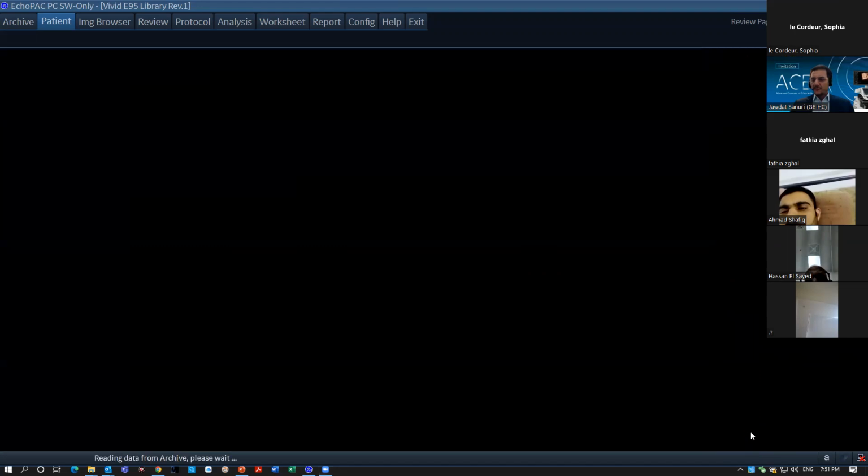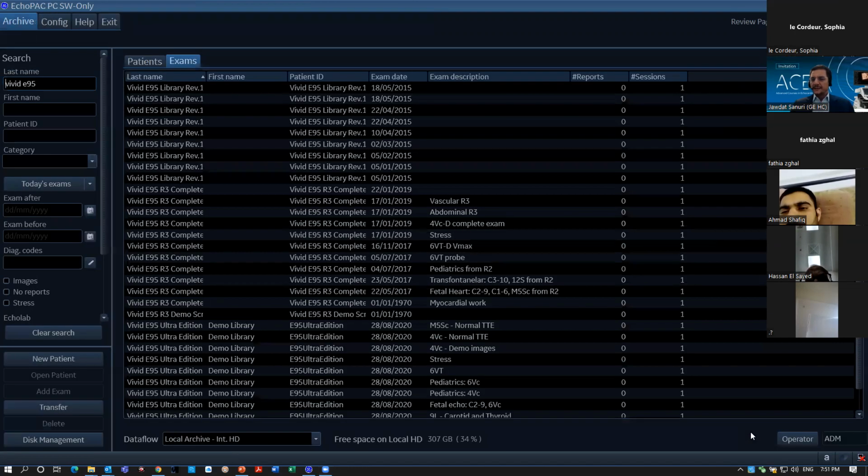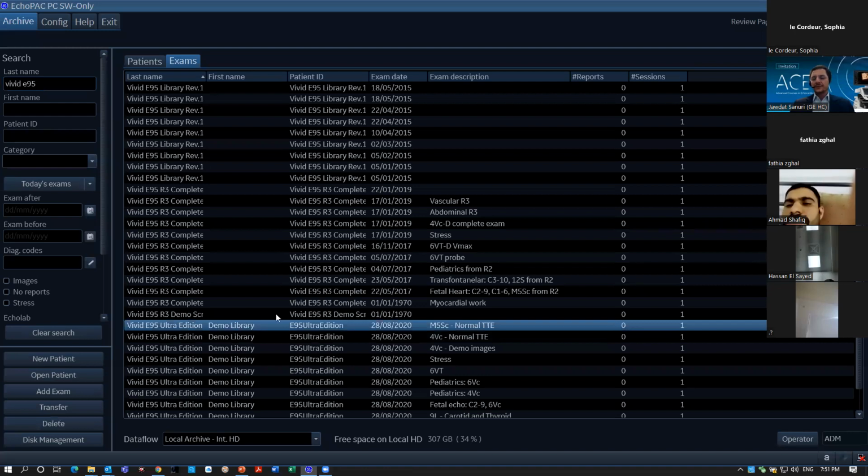So if there are any questions or comments, please feel free to ask anytime. Let me just hide this again. You can also write questions or comments in this chat box where it says chat, or you can raise your hand and say something if you want to. So anyway, let me just jump to the study that I'm trying to capture here for the mitral flow as well as E prime, basically.